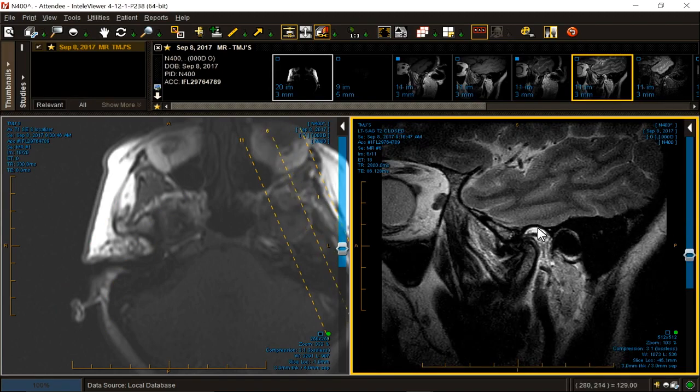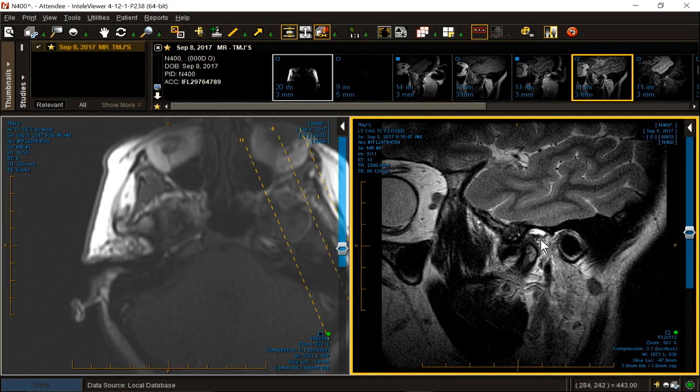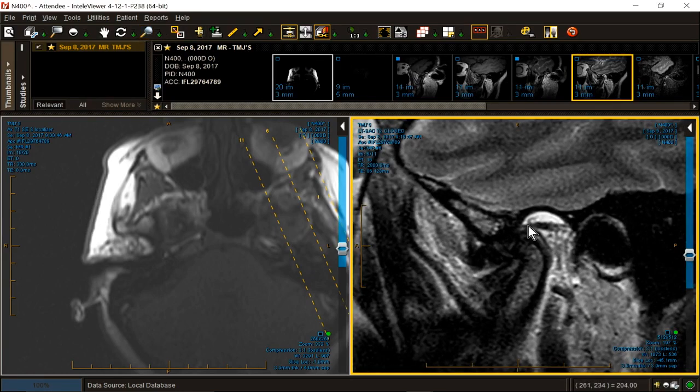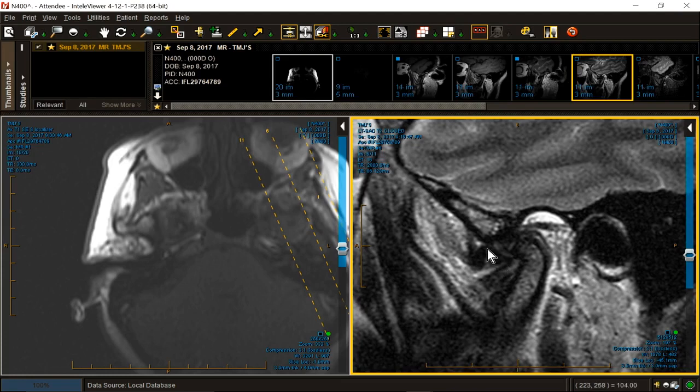This time we have an upper compartment effusion on the T2, and we have a thickened attachment. It's still there. We have a condylar attachment. Let me blow it up. Condylar attachment, upper squamotympanic attachment, effusion. They're scarred to the back of the articular eminence, but they are not connected to the meniscus, which is down here as an S-shaped structure lying on its side. It looks like a little green worm.